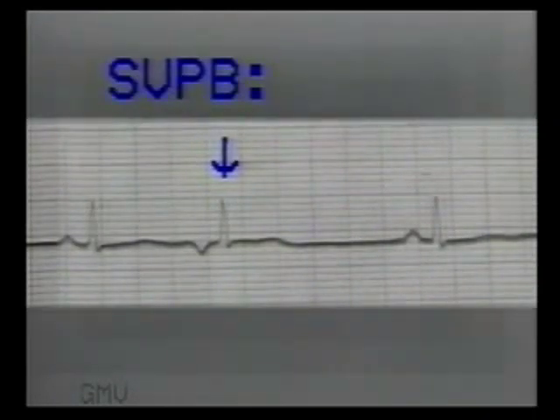In these beats, the impulse will reach the ventricles via the normal conduction pathway. So the QRS complex on ECG will have a normal configuration. This is a nodal premature beat.